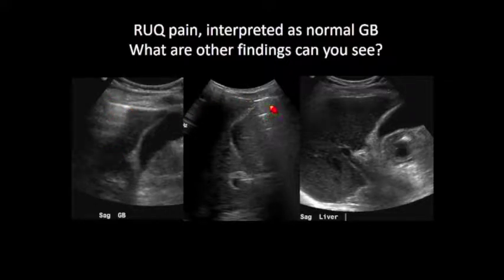And here was another image. He had a bunch of random images. He was trying to find the gallbladder, and there were all these weird ring downs, et cetera. So this is odd, and this is gas. And it's true, some patients might have a bowel loop up there in the right upper quadrant, but this to me didn't look like a bowel loop. It looked like extraluminal air.